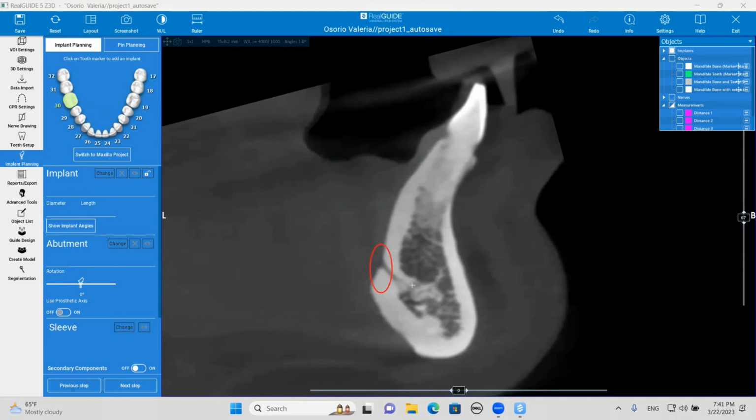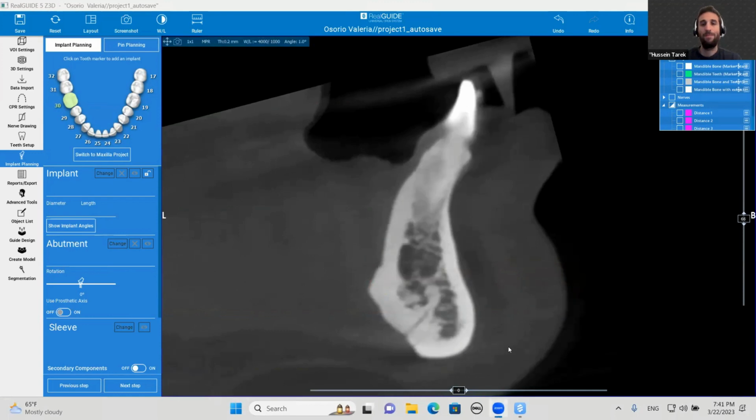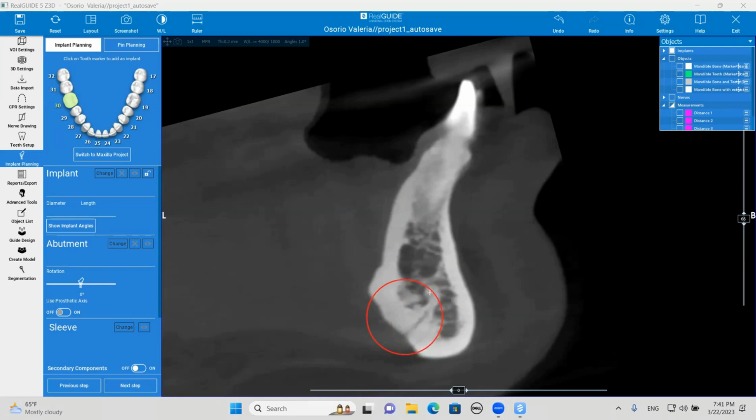Okay. And then as he clicks, what happens is these arteries transverse through the mandible. Sometimes I've seen them go up, actually coronally, right by the teeth. This one comes almost to the midpoint of the mandible, and then it looks like it takes a nosedive apically. So click a couple more, about 2 or 3 clicks right there. Perfect. And it comes through the actual lingual aspect of the mandible. Okay, so this one transverses.